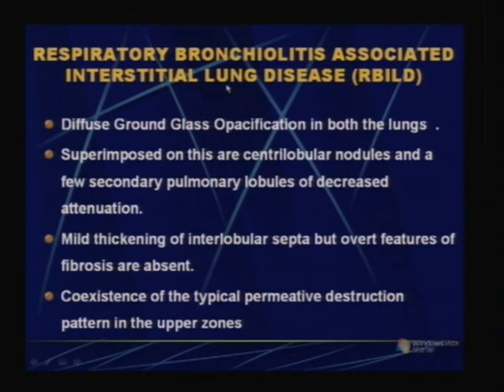In RBILD, there is mainly an involvement of the peripheral airways, and there is sparing of the interstitium, sparing of the alveoli. But in cases of DIP, there is involvement of both the small airways and the airspace in the surrounding area.